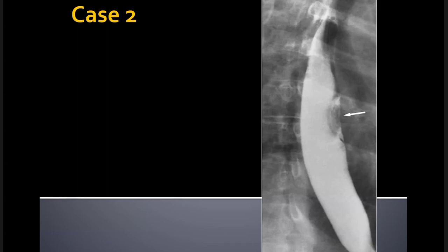My findings, madam: it has a smooth border. So one is my leiomyoma. And the other could be some ulcer. Yeah, good.